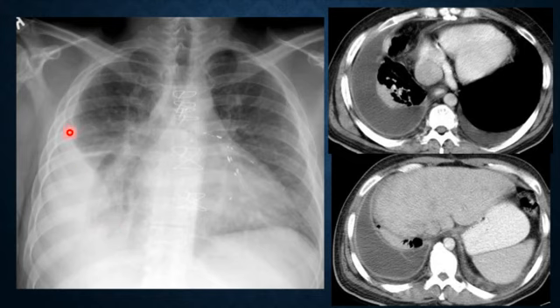It's located in a certain part of the chest. When we take a CT scan, you can see that the pleura is thick and enhancing, indicating it is an empyema. It is an inflammatory reaction of the pleura to the presence of pus, making it loculated in a certain part of the chest, not like pleural effusion just flowing everywhere, forming the meniscus sign. Everything is good.